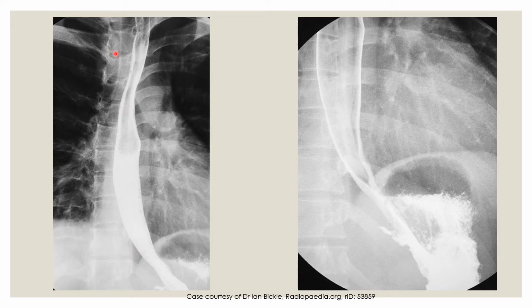So what we have here is we have the thoracic vertebral bodies, which are high in density. We have multiple ribs. So these slightly horizontal ribs are actually the posterior ribs that we're seeing, and you can see it joining into the costovertebral joint, sorry, here. These structures represent the clavicles, and we can see black density. Black density represents a structure that is filled with air, and in this context, it represents the lungs.